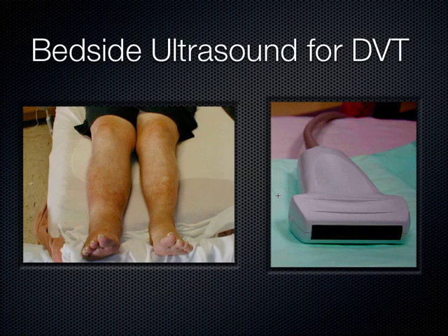The linear transducer in these cases, some people call this a vascular probe, but we can use it for so many more things than just blood vessels. And what's the biggest blood vessel in the body? The aorta. It's a deeper structure. You wouldn't want to use this probe on the aorta because you've got to get the sound to penetrate all the way down to the spine, basically, to see the aorta. So that's why I don't really like calling this the vascular probe, because it's got so many uses and you wouldn't want to use it on the biggest blood vessel. So I always call it the linear probe. But just so you know, you might hear someone call this the vascular probe. And it's the one with the highest frequency.